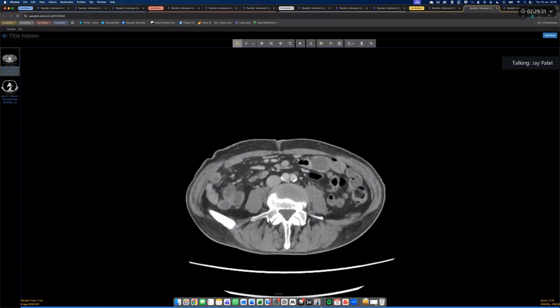No, let's leave it there. Exceptional, exceptional. Really well done for seeing that. It's not easy. I think the human eye does not look inside the bowel. We typically don't. So well done for finding it, and then well done for finding the node in the adjacent mesentery.